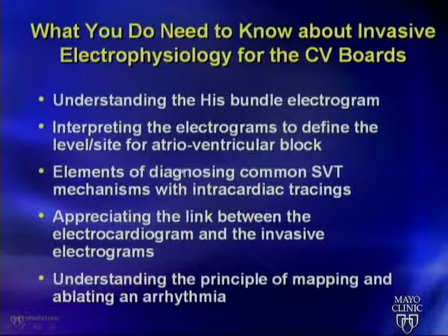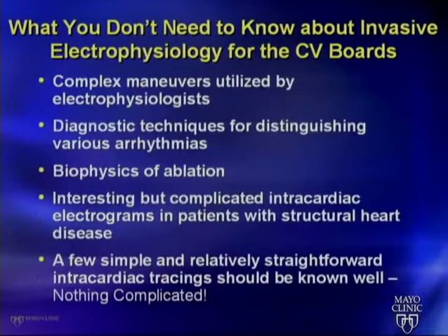So, intracardiac tracings for the cardiology boards, there are just very few things you need to know, and it was actually pretty much covered, 99% of what you need to know, in the question that was just presented. But you have to understand, recognizing this His bundle electrogram, and figure out the level of atrioventricular block. Some very simple tracings related to diagnosing ventricular tachycardia versus supraventricular tachycardia with intracardiac tracings. And all of this we'll cover in the next few minutes.